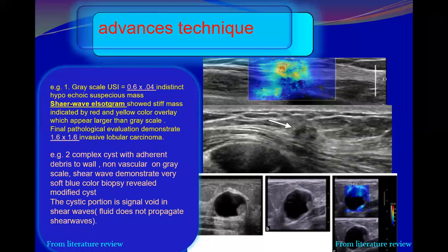No, they consider it soft generally, because it is predominantly just blue, you see. So they consider it, and they found it just a complex cyst. This is from the literature. Okay, thank you, Dr. Rabab. And your case. Okay, complete.